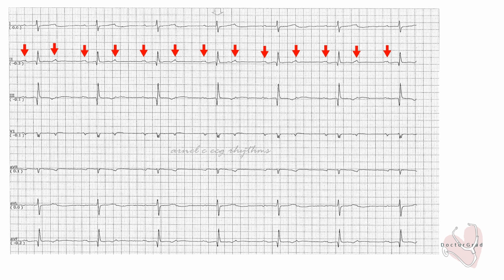Let's see some diagrams and try to decode what this means. Here we have a P. There is a QRS following that. Here we have another P that has not been conducted. We have a third P that has been conducted. We have a fourth P that has not been conducted. The fifth P is being conducted. That means alternating P waves are conducted. So this is a 2:1 heart block, which is a Mobitz type 2 heart block.